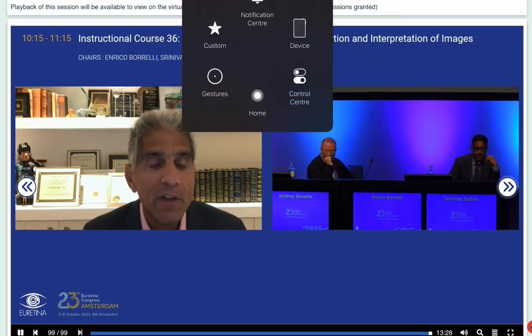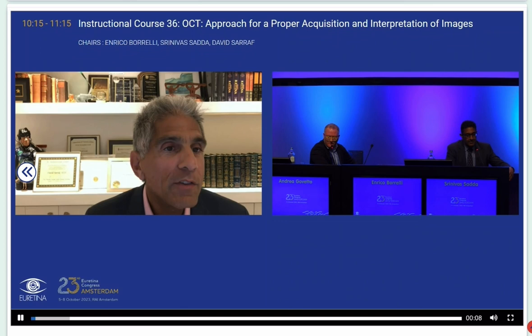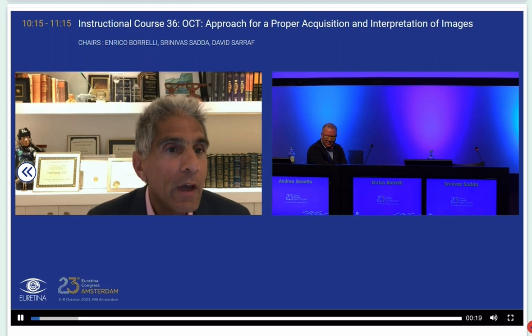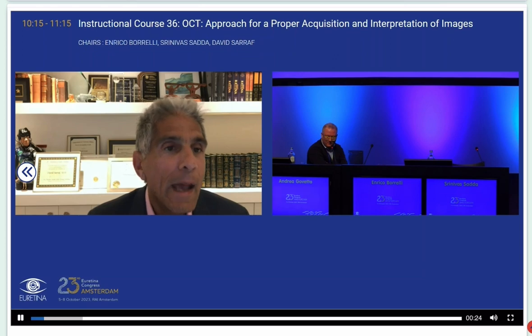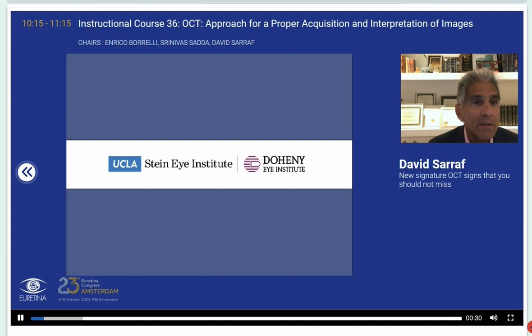I just need to get my slides up. The atrophic holes, it looks like there may be tangential traction, and that's a wonderful observation, Andrea. But because the traction is encapsulated within the vitreous base, it may decrease the risk of detachment, as opposed to tears, especially flap tears, where there's release of the vitreous, and there's not that same encapsulation when the vitreous is separated from the posterior pole or from the equator, allowing a detachment to occur. So I think that's why we may see a decreased risk of detachment in these holes, even though there may be traction there.